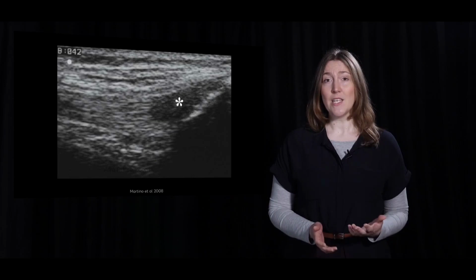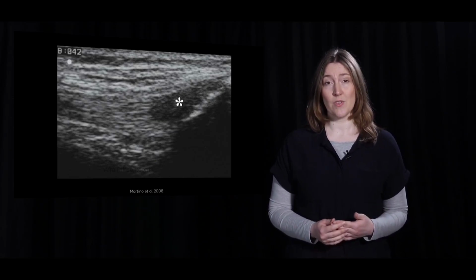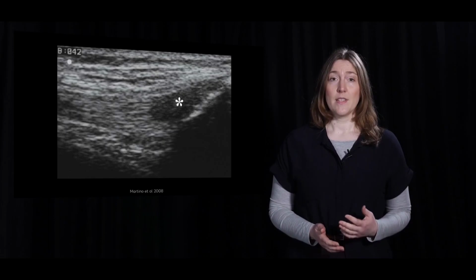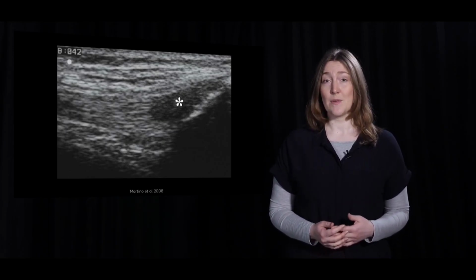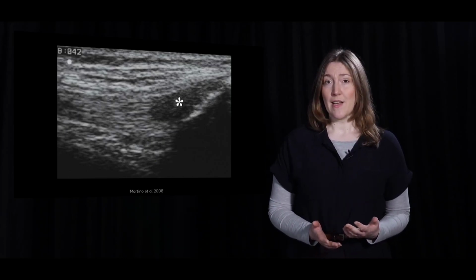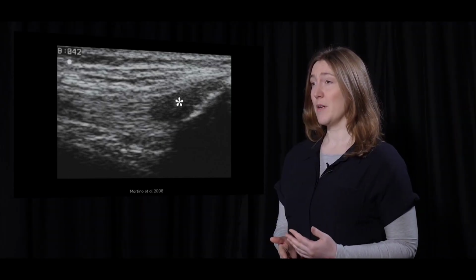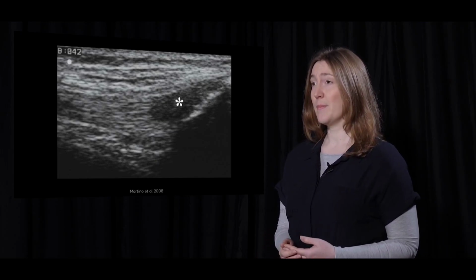Artefacts can be defined as any structure in an ultrasound image that does not have a corresponding anatomic tissue structure. So actually a ghost image. Artefacts are a common occurrence in an ultrasound display, since they are often the result of the physical properties of ultrasound itself. You will learn more about artefacts in a presentation in the Basic Level 1 course. Recognising artefacts is essential to proper ultrasound interpretation, as not identifying an artefact leads to misinterpretation.